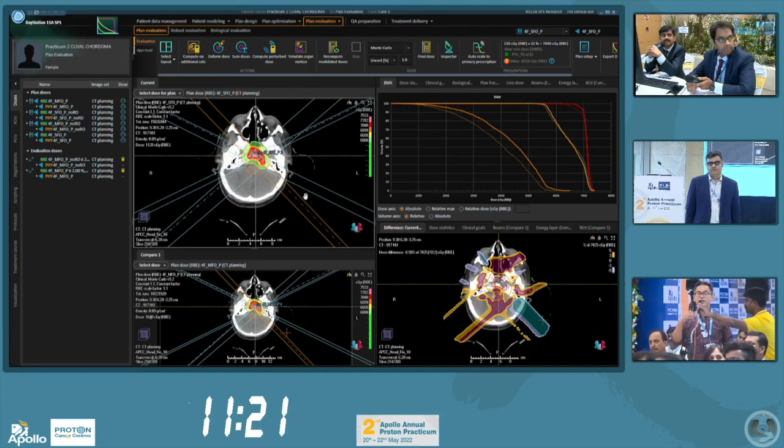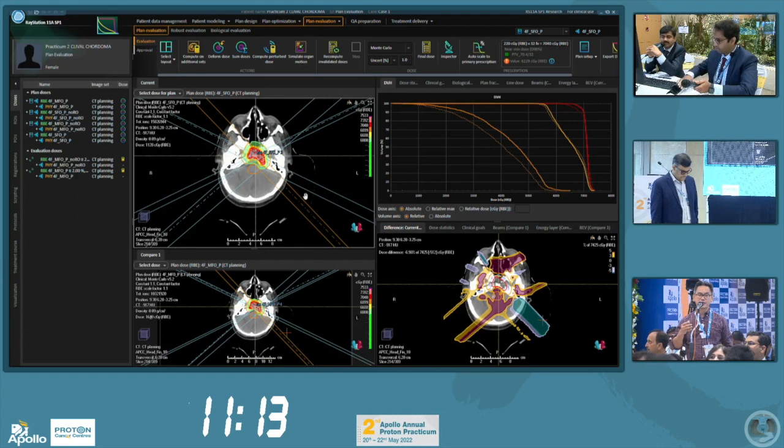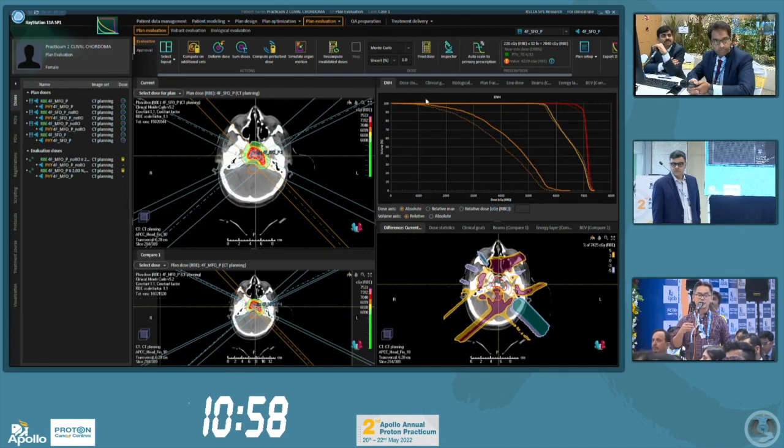Even in that situation, since the IMPT he is demonstrating is so heterogeneous, if there is a slight deviation of that particular material during treatment, it may perturb or shift the entire dose distribution. That's why SFO is more robust in those clinical situations compared to MFO.